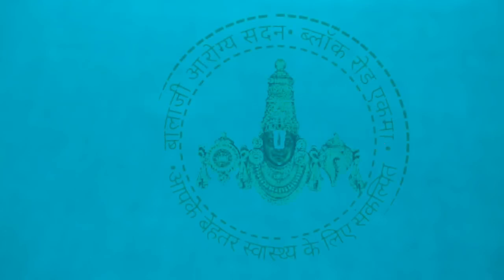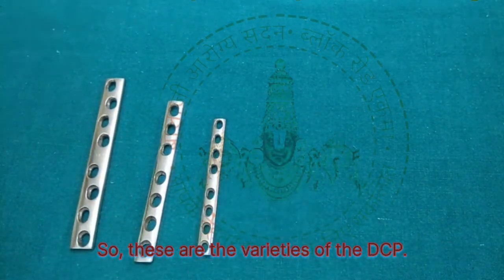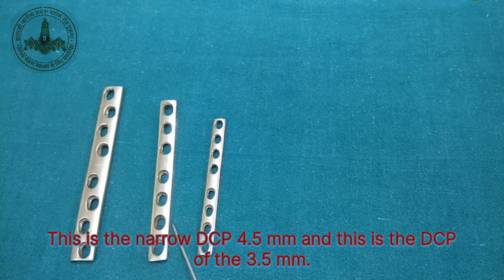Today I will discuss the basics of the plates. The basic plate is the DCP, so we start with it. These are the varieties of the DCP. This is the broad DCP 4.5 mm. This is the narrow DCP 4.5 mm and this is the DCP of 3.5 mm.